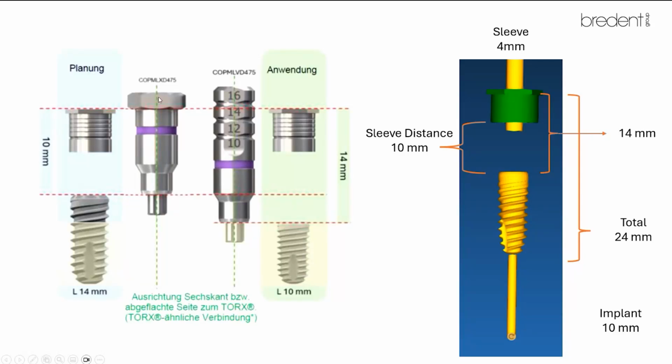And the sleeve also has a hexagon here. Even this has a hexagon on the sides. If you see from the top, you can see the hexagon. So you can match how you are placing implants. About the hexagon talks like connection, I will talk in the next subject. But here you have to understand how the depth is measured. I hope this is a little confusing, but I try to make it as easy as possible.